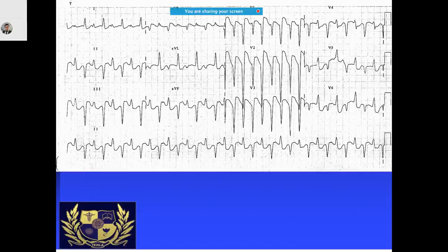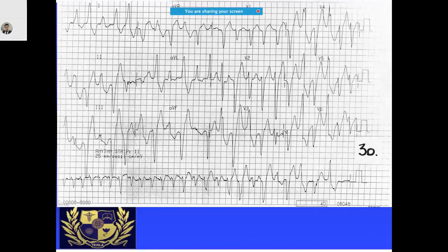So most commonly, this tachycardia is associated with severe digoxin toxicity, and it may be the rhythm, for example, if there is a patient of familial CPVT, catecholaminergic polymorphic VT, those patients can also be having it. And yes, if someone is using herbs like aconite, they may also have this kind of problem.